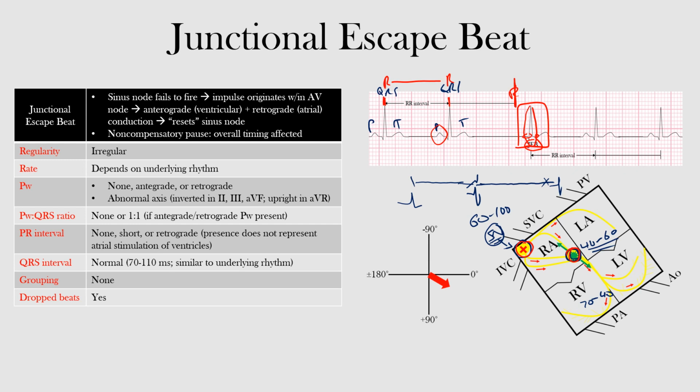Notice that the QRS complex that we're seeing here is normal, like all the other complexes in the similar underlying rhythm. So that's the general overview. Now let's look at this in a little more detail.